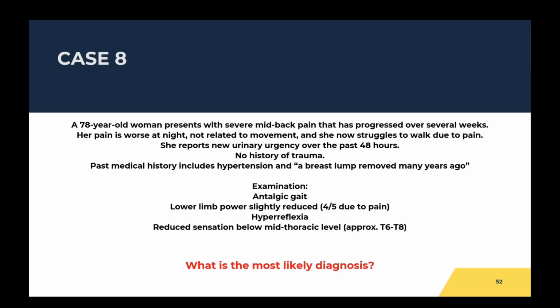Cauda. Yeah, metastatic spinal cord compression. Yeah, okay. Let's go through this then.